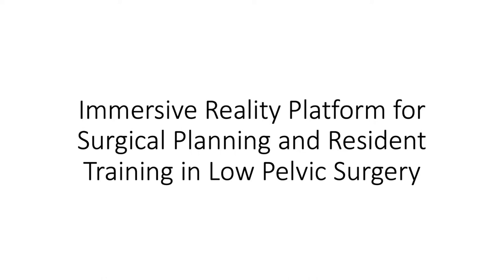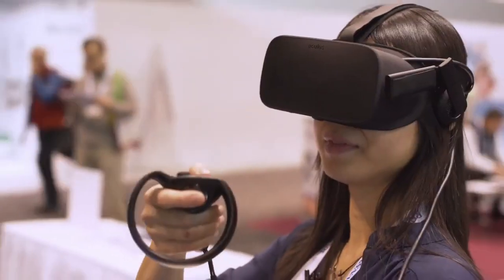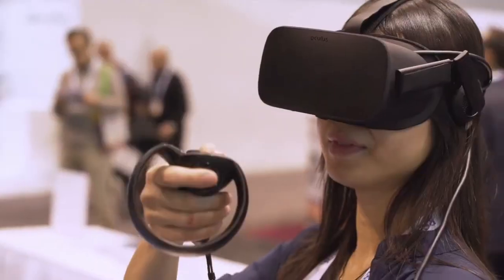Immersive reality platform for surgical planning and resident training in low pelvic surgery. This project was a collaboration between the University of Illinois at Chicago and ImmersiveTouch. Models were constructed by ImmersiveTouch and viewed using their ImmersiveView software.